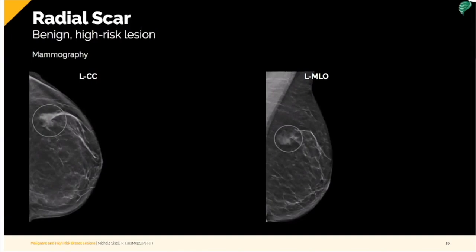Here's a 70-year-old patient that came in for her annual mammogram. She was called for additional workup after a closer look at her 2D and her 3D mammogram. On the 2D images, the lateral, superior, and posterior, so lateral would be here, superior, and then of course they're both posterior, looked more dense, similar to the LCIS case we looked at earlier. So then they looked at the 3D exam and it had more information. On the 3D tomosynthesis slices, the area definitely holds up and has more irregular margins.